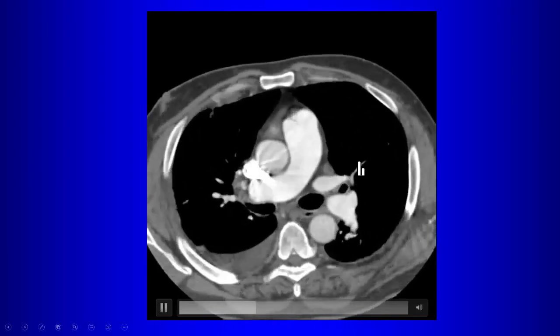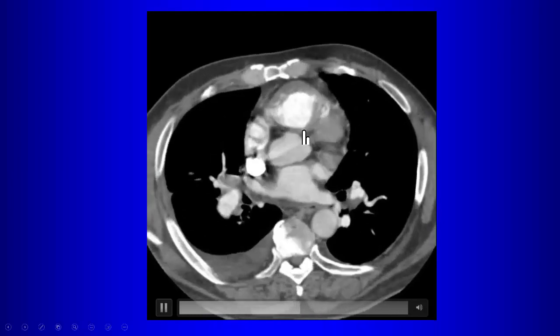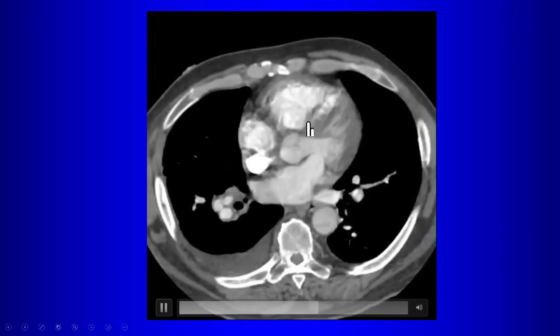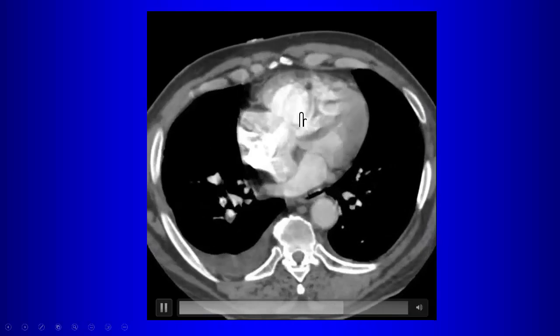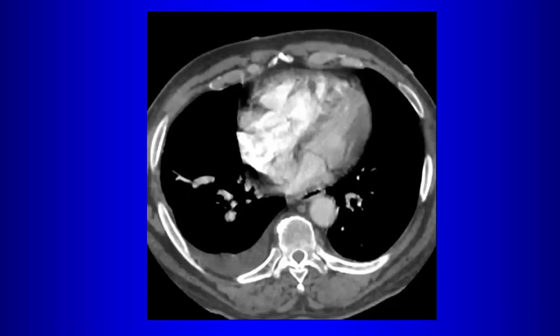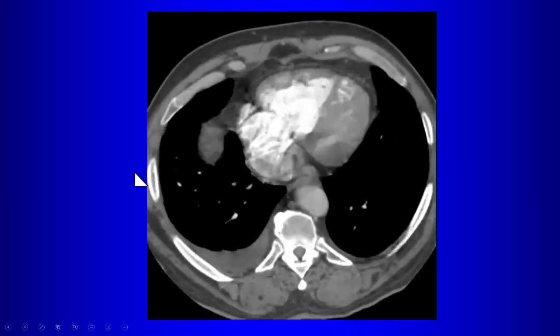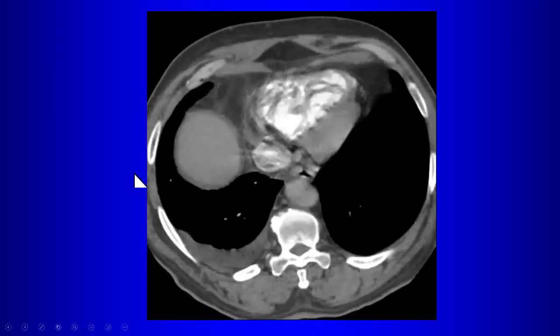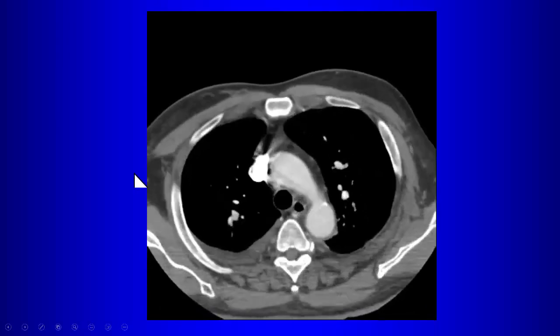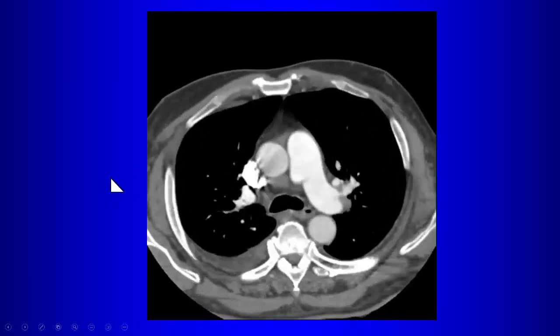Is this an acute or chronic problem? See, that right ventricle is going to be big, but is this an acute problem or a chronic problem? Why do you think it's chronic? Because the muscles in the right atrium is so thick. Not the right atrium, but the right ventricle. Yeah. There's right ventricular hypertrophy, right? The anterior wall there is thickened. So the right ventricle is dilated from increased pressure. It's hypertrophy. So what's the cause of this then?